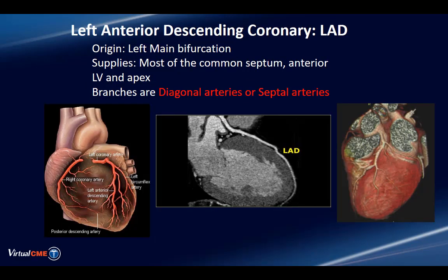The left anterior descending artery is also a vessel of tremendous importance, largely because it typically perfuses the interventricular septum as well as the anterior wall of the left ventricle. And here we see it rendered in the three-dimensional volume rendered technique in the colorized image here. Much of the associated cardiac structures have been pruned away, so we can see the left main and the bifurcation into the left anterior descending and the left circumflex vessel. And we see one large bifurcating diagonal artery over here.